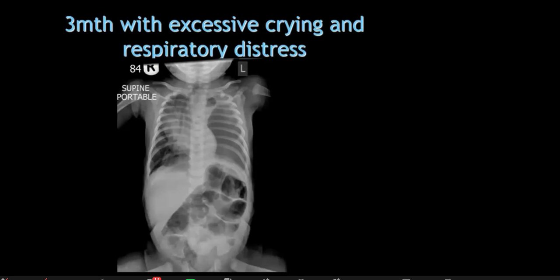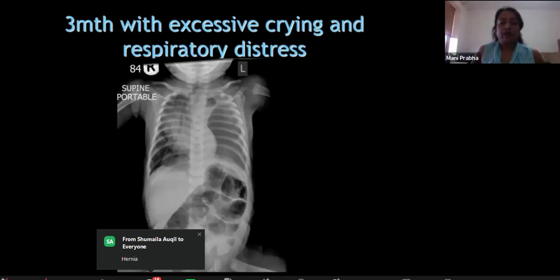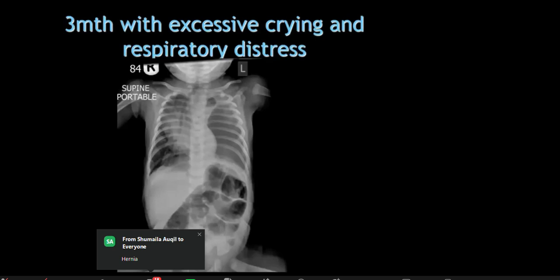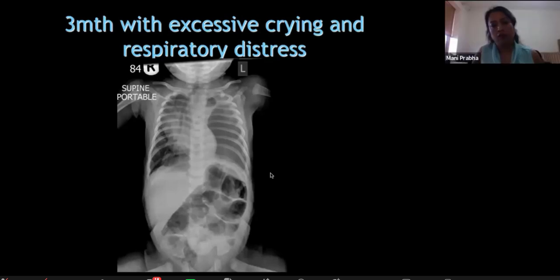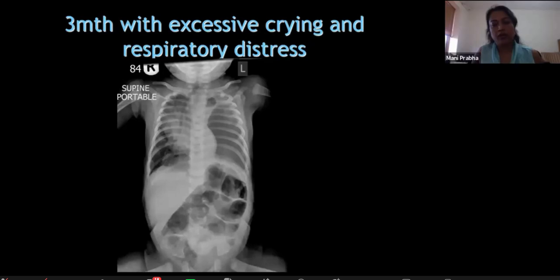I mean, if that's not lung, I think I can see a good left hemidiaphragmatic contour, but one of the differentials would be a large left-sided diaphragmatic hernia, and that is actually viscous. Okay, how would you proceed to investigate it further and to confirm? So a chest ultrasound would probably reveal what is beneath the pleura. Okay, yeah. And many of these patients receive cross-sectional imaging as well. Yeah, you would like to reserve cross-sectional imaging if you can get the diagnosis with ultrasound.